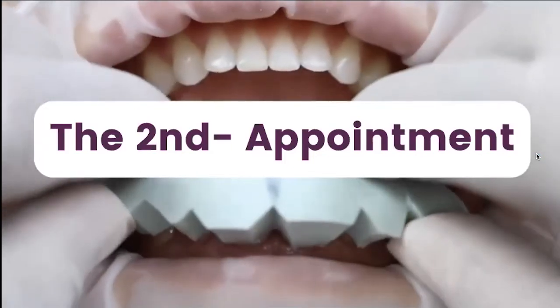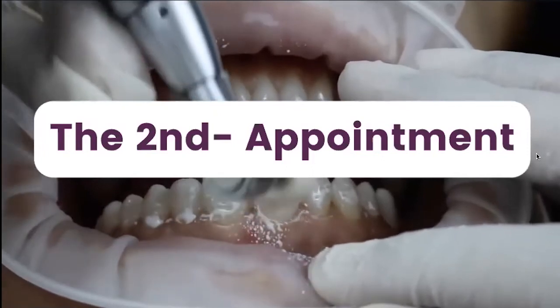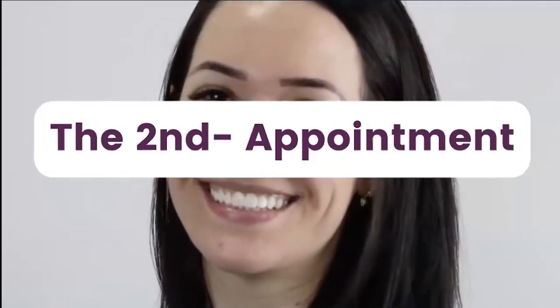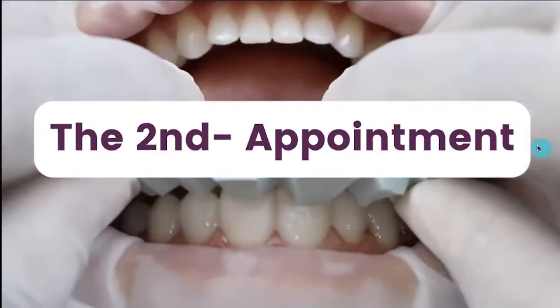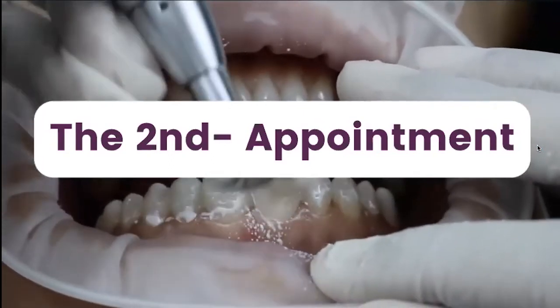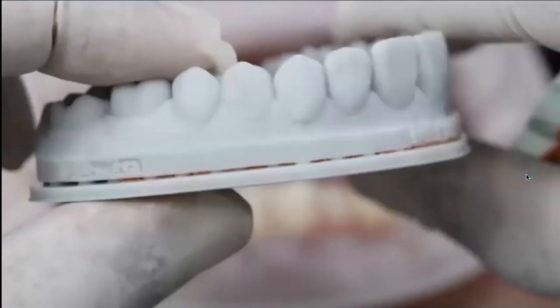Once you call your patient for the second appointment, since you already have two models that are 3D printed, you don't have to spend a lot of time in that second appointment. No more than 30 minutes is enough for you to perform your 3D wax-up trial.